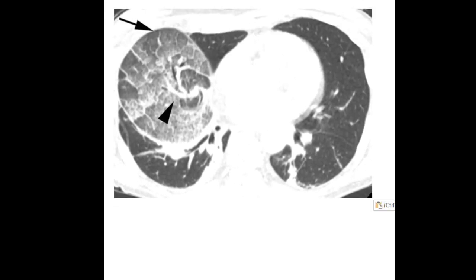So these are some acute thorax cases, and again, not all of these are acute. I'd say maybe 2 or 3 of them are non-acute. If you know the answers, feel free to leave them in the comments below.